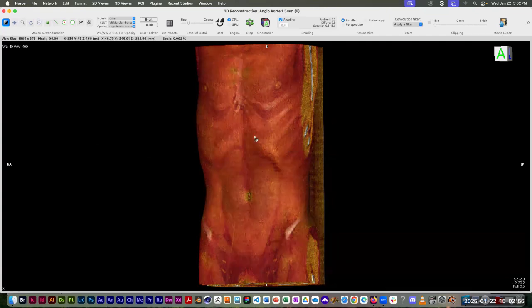You have to be really delicate with this tool. Essentially, what I'm going to do is demonstrate that you simply can drag it left or right, or drag it vertically up and down. And each way you drag is going to have a somewhat different effect on the body. Well, what you find is if you make a really big drag, you drag it very quickly across the page, all hell breaks loose and the screen just goes nuts, and you just see a bunch of static, or alternatively, your image just completely disappears. So generally speaking, you want to make very small moves to adjust these things in a very controlled way.